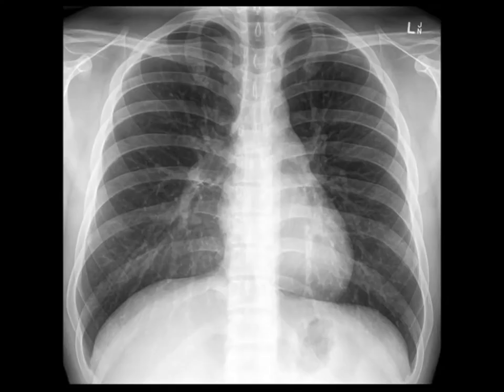This is an ideal scenario where we assume that we have the patient's information and we know what kind of radiograph it is. This is an upright PA chest film of Mr. Duffy, taken on the 1st of January this year. Exposure is adequate, the patient is not rotated, and there is no motion blurring. Airway is central and patent.